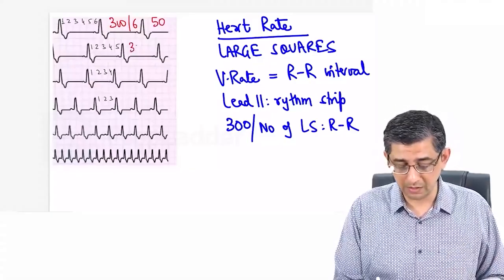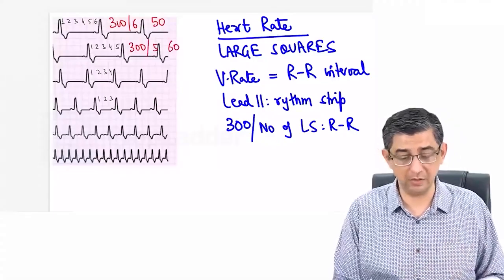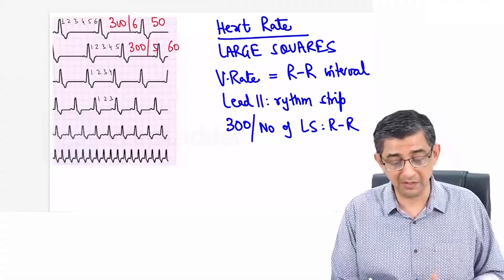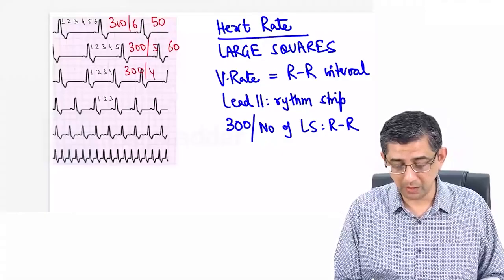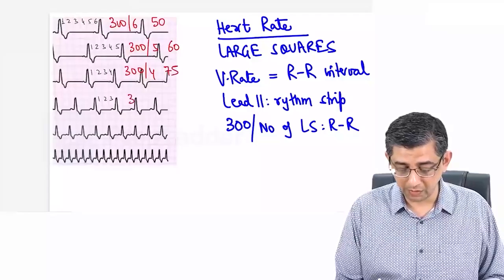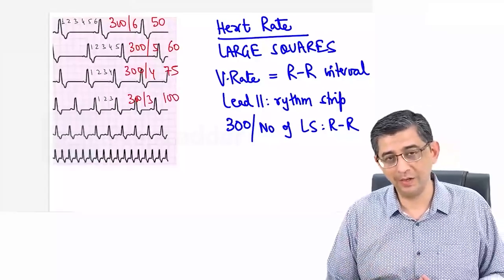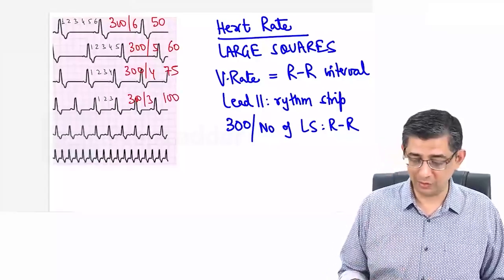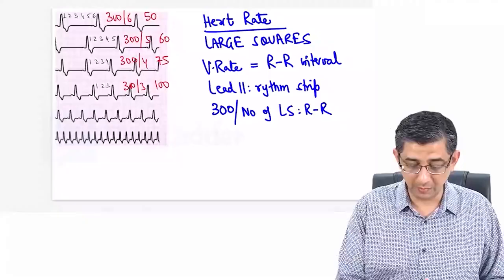In the next ECG that I've highlighted before you, the heart rate is coming down to the lower limit of physiology, maybe a hypothyroidism patient hitting 60. But this is going to be the value for you and me, that is approximately, I'll put it at 75. And now we're going towards the tachycardia range. I want to highlight, I'm not teaching you any kind of mathematics. I just want you to be very comfortable with these values. Why? You will see the importance immediately.